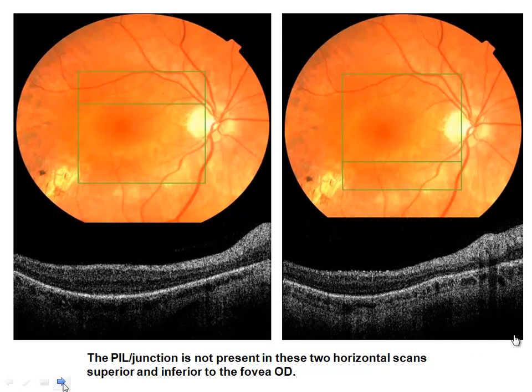And this, again, can help you make a diagnosis of retinitis pigmentosa with or without an electroretinogram. ERGs can confirm it, but are probably not essential anymore as they were in the past to make some of these diagnoses. Here we're getting a section. By the way, these boxes are 6 by 6 millimeters. We typically take 128 horizontal sections through it.